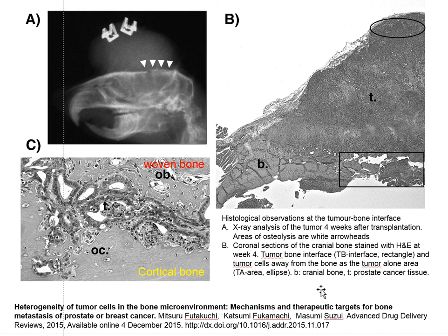And this has been shown classically in this very nice study which was published last year, with the metastasis growing on the skull of a rat. And if we just look at that inferior margin of the lesion, there is the high cellularity along the edge of the lesion with woven bone on the inside and cortical bone on the outside.